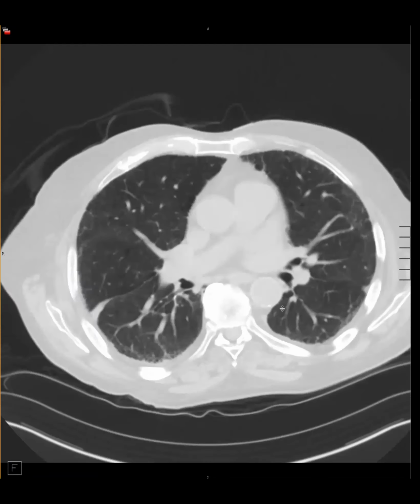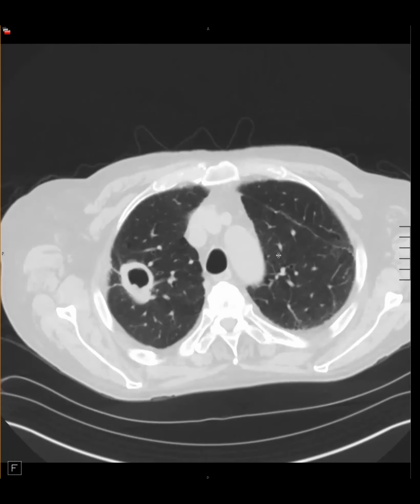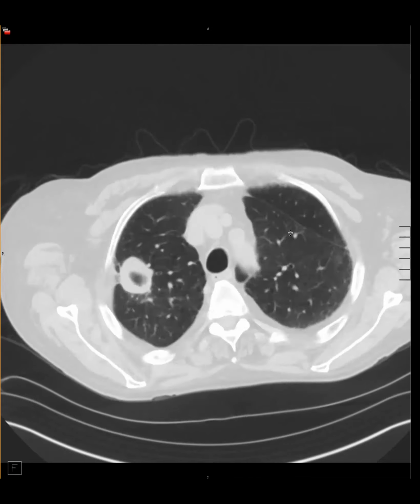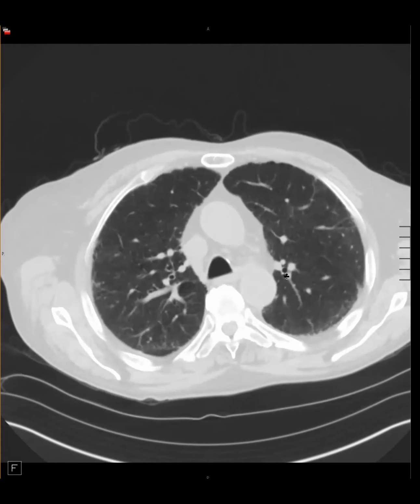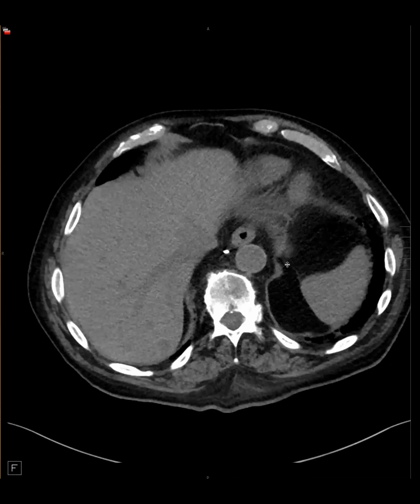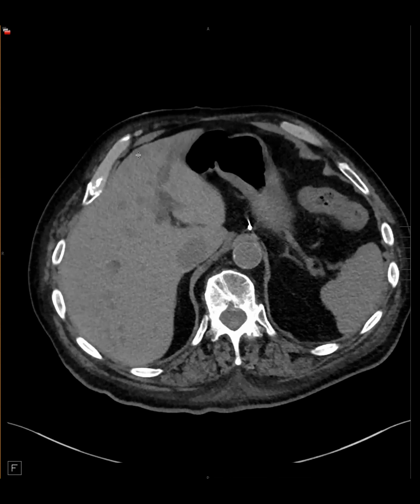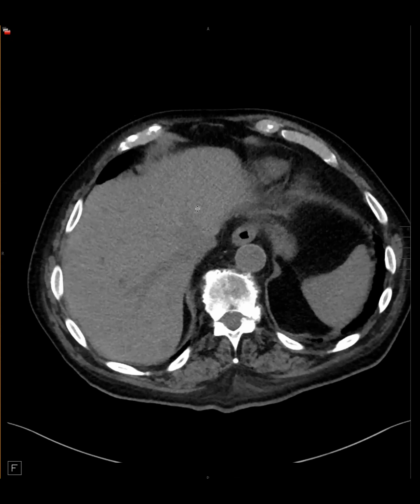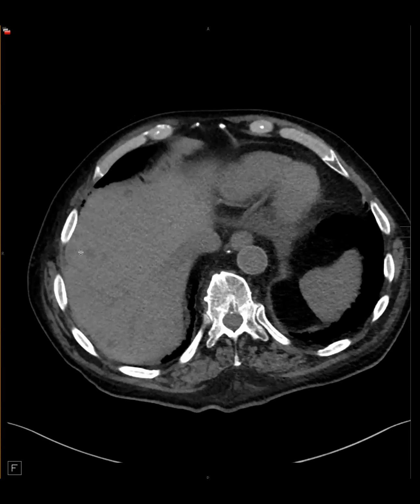Patient with these chest CT findings right there. This turned out to be Cocci. And on CT, our astute thoracic radiologist found all these little low density lesions in the liver, all over the place.